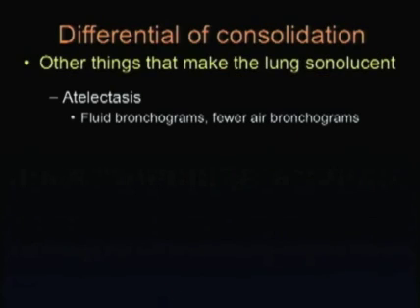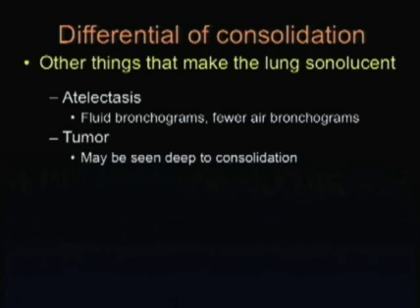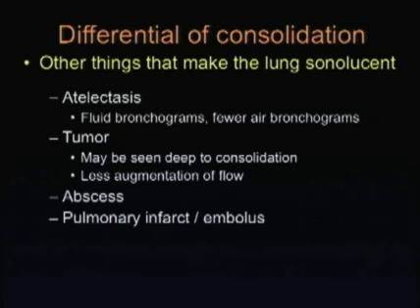The differential of consolidation of these sonographic findings: first is atelectasis. You might see fluid bronchograms to help distinguish, and there might be fewer air bronchograms, although the old idea that there would be no air bronchograms in atelectasis is not borne out. Tumor may be seen deep to consolidation or standing alone. Again, it will not have air bronchograms. It will have internal flow throughout, although it'll have less augmented flow than an inflammatory process such as a pneumonia.